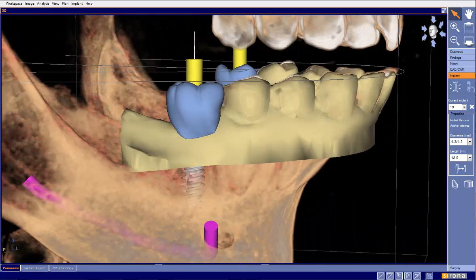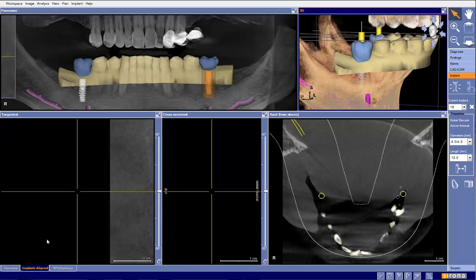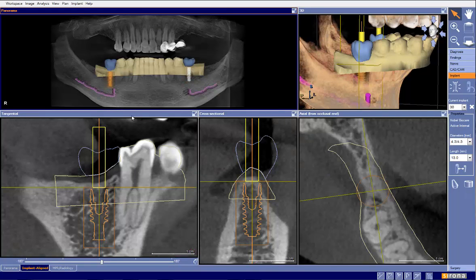Now when we come to the other side, what I'm seeing here is something more along the lines of this. Now, what I would do is when I would draw this, I would actually draw this margin in the CEREC side of things. I would draw this margin more like right there. And that would look more along the lines of what we're doing there. Again, minor things, doesn't make that big of a difference, but it's the little things, the attention to detail over time. So let's go ahead and start here in site number 30.